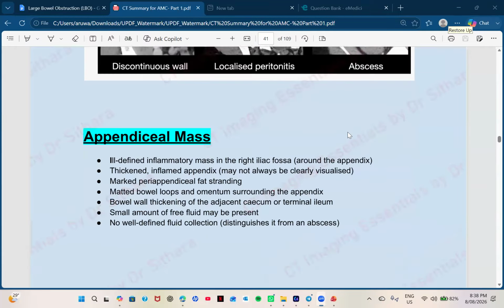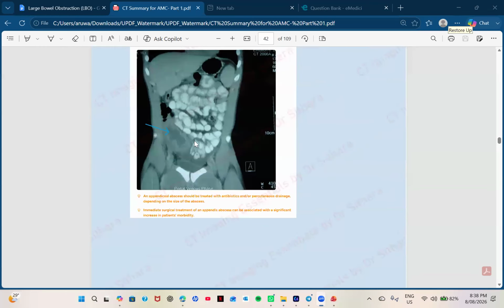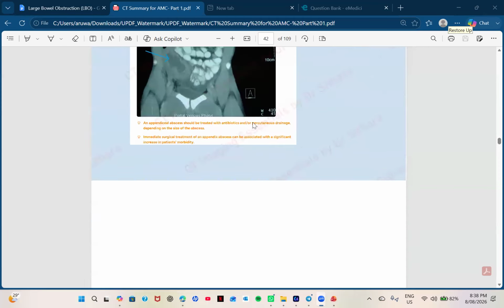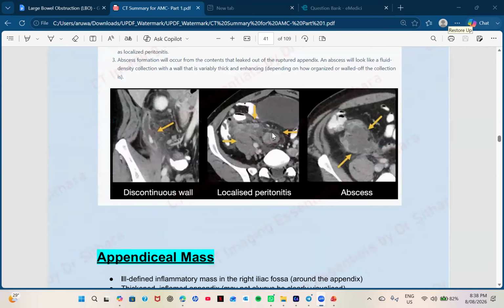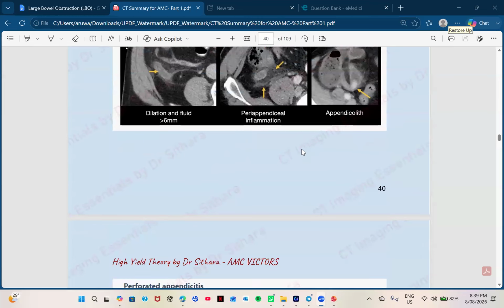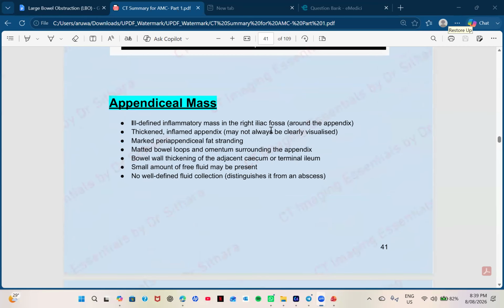Okay, I'll show you, because in e-medicine we have two questions, right? This is the one, and where's the other one? Yeah, this is the other one. No, this is not the other one. I have only attached one question, because this question came under phlegmon and the appendiceal abscess, right? Okay, so I hope you get the idea, because I don't have better images than this. These are the only images that I can show you.